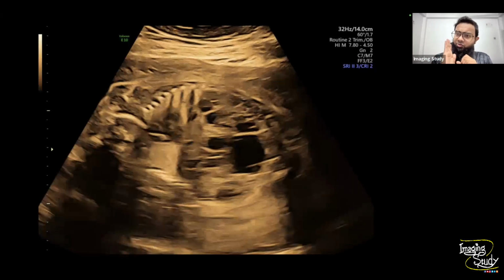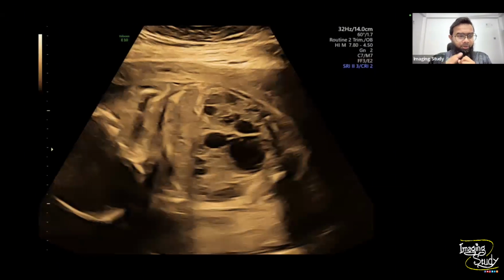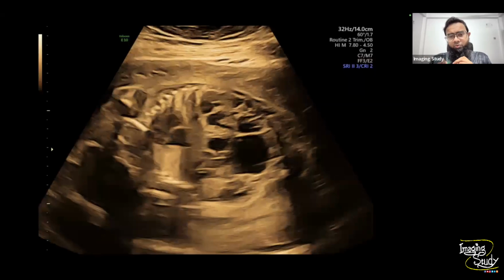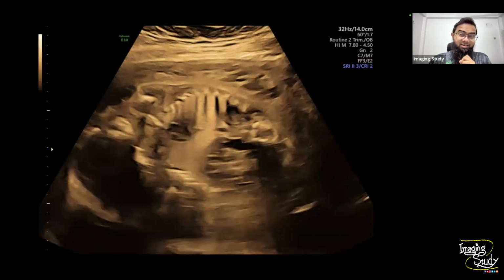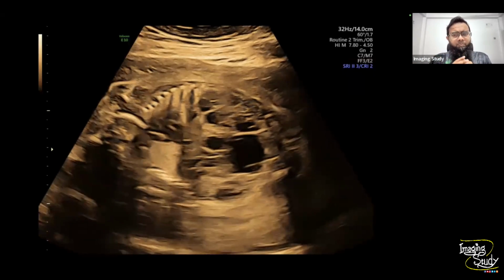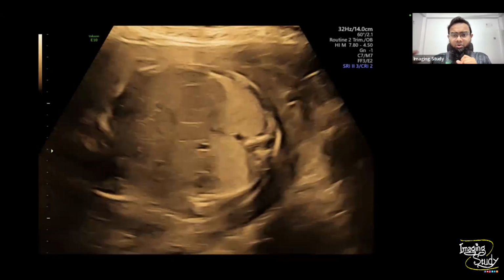So whenever you see cystic spaces in a large kidney in the gestational period, you have to diagnose it as multicystic dysplastic kidneys. We call it renal dysplasia because if you look at the renal parenchyma, you will see that the parenchymal echogenicity may be increased. And these are dysplastic kidneys, so they won't produce any urine or may produce only a small amount. So you need to check them. We'll check the urinary bladder area to understand whether there is any presence of urine.